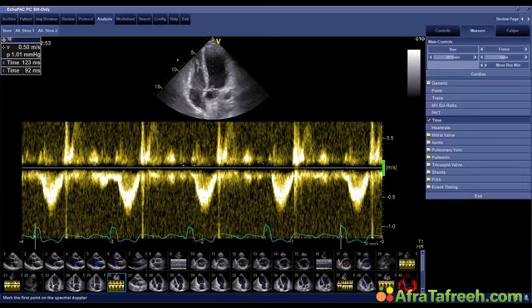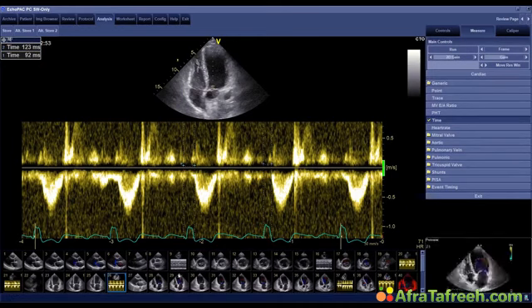It is not used as much anymore, but I still believe very strongly in this parameter as a very global parameter, which helps you discriminate between patients who have dysynchrony or not. The cutoff value is 140. If you look at these values, no matter which part of the QRS complex we're measuring, we're far below 140. This confirms that the patient does not have significant dysynchrony.